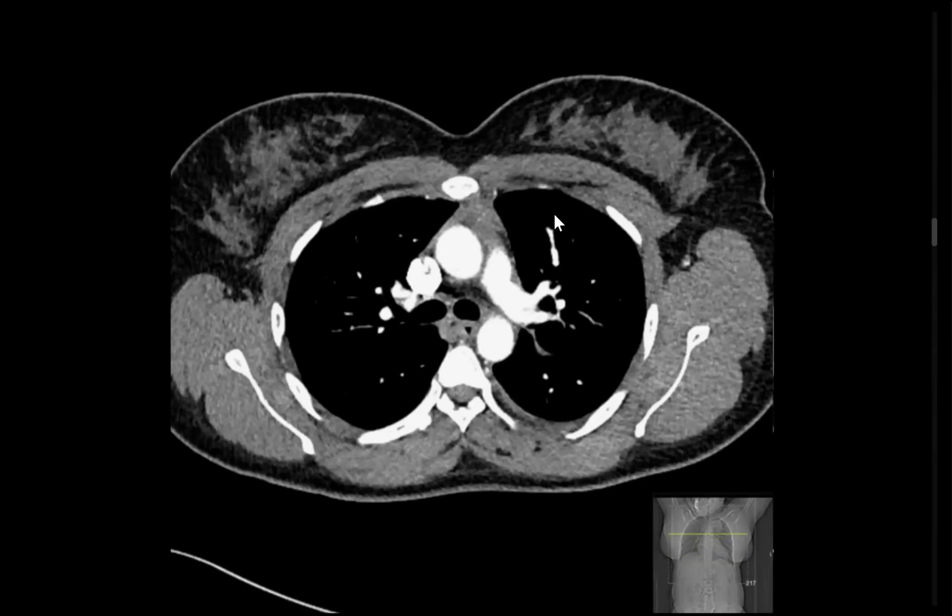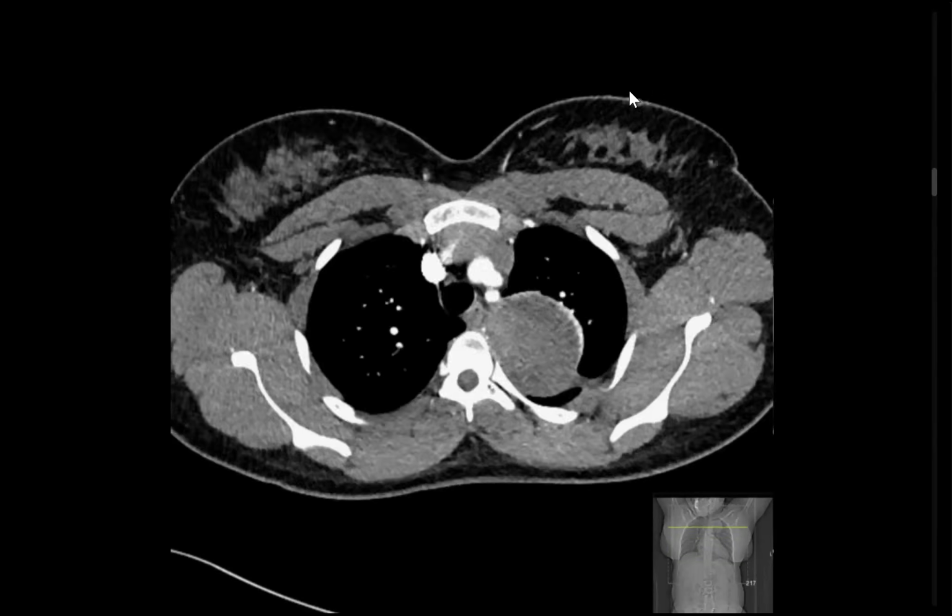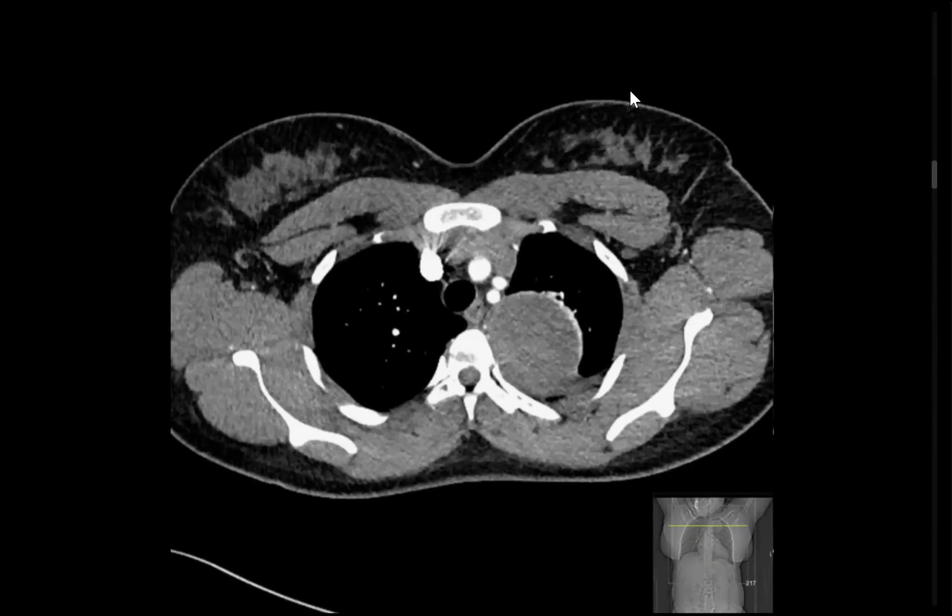No problem. Now concentrate. You stayed a long time without saying any word. This is a negative attitude. It must have been lagging, but talk. Tell the examiner, I'm scrolling from the first till the last cut, in this patient who is complaining of such and such. If there is a lag or any technical error, mention it immediately and report it after the exam. What do you see here?